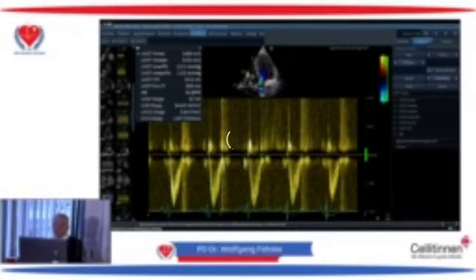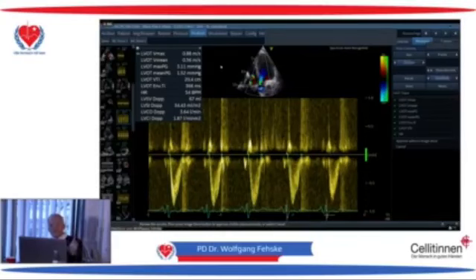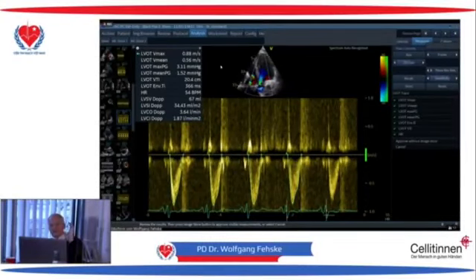Reduced, the pulmonary artery. We must put these data together. So we have a little stroke volume coming out of the right ventricle, and that corresponds, of course, to the left ventricle, which can be quantified as we did it here.